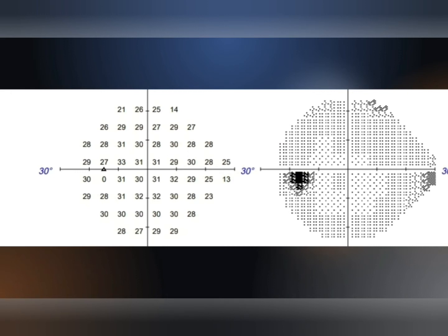As we go to the periphery, the raw data values decrease. So you can see that in the central 5-degree area or central 10-degree, the sensitivity of the retina is quite high, because a high amount of sensitivity is there near the fovea. But if we go to the periphery, then you will see the reduction of these raw data values.